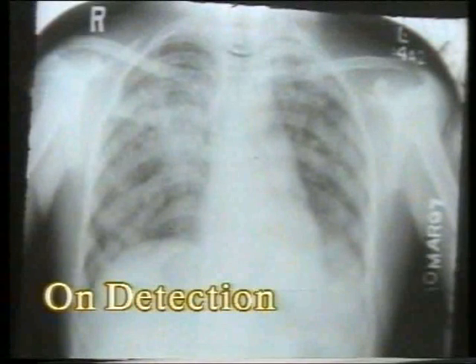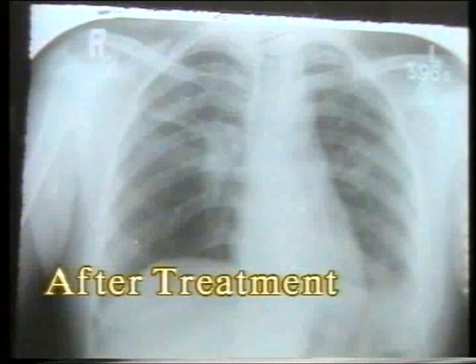Note this X-ray showing infiltration in the right mid-zone and the left upper zone on detection. After completion of treatment, the right mid-zone shows residual fibrosis, while the left upper zone has healed without trace.